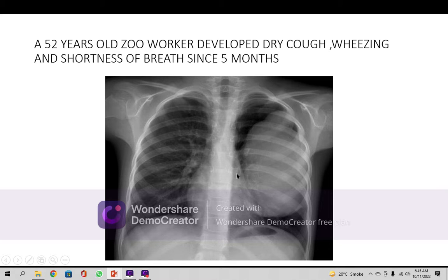So is it acute inflammation? Let's see the differential diagnosis. Acute inflammation could be just a big abscess, if it is there as a result of a lobar pneumonia. The fluid level is seen, but the patient is not symptomatic. She should have a high grade fever, etc. And erosion is more common, hemoptysis, and expectoration. Chronic inflammation in this country is common.